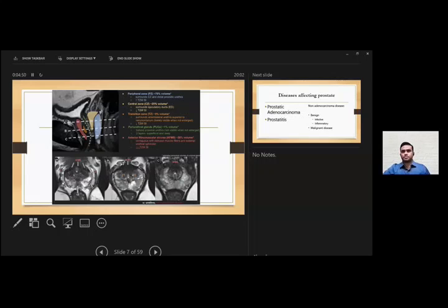duct. Coming to the mid gland or the mid level of the prostate, we can see both the peripheral zones as well as the transition zone. It is at these areas that we try to see the neurovascular bundles, which are located at 5 and 7 o'clock positions. Further inferiorly, when we reach the distal part of prostatic urethra, it is predominantly the peripheral zone that surrounds the prostatic urethra with a part of the anterior fibromuscular stroma.